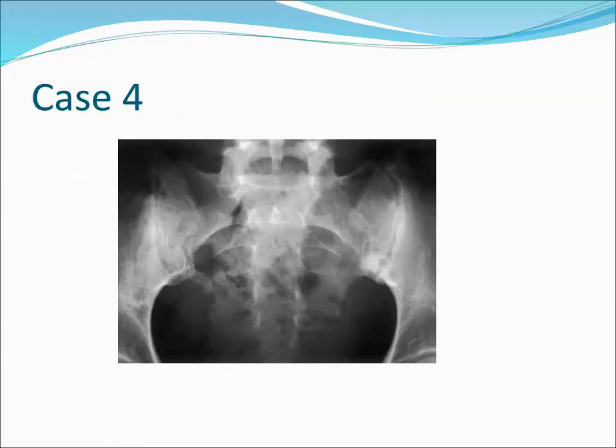A young woman, who is a professional dancer, complained of left-sided hip pain. This AP of the pelvis demonstrated left SI joint sclerosis, joint irregularity, and erosions. A complete workup to rule out an HLA-B27 spondyloarthropathy was negative, and no laboratory or clinical evidence for infection was found. Her clinical history pointed to this process being completely occupation-related, and an aspiration biopsy to rule out infection was therefore not performed. This is not an unusual appearance for DJD joints which exhibit erosions of the SI joints.